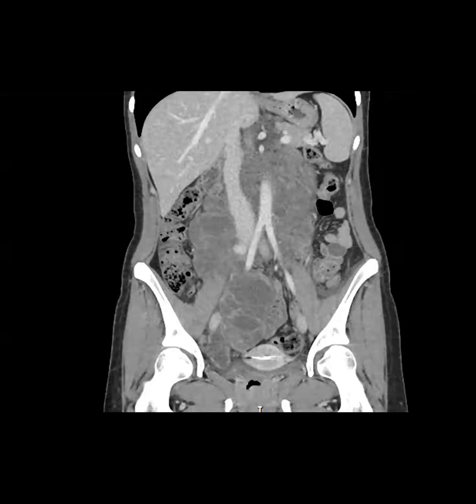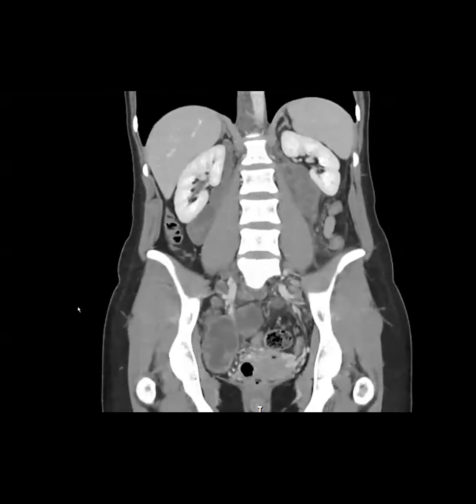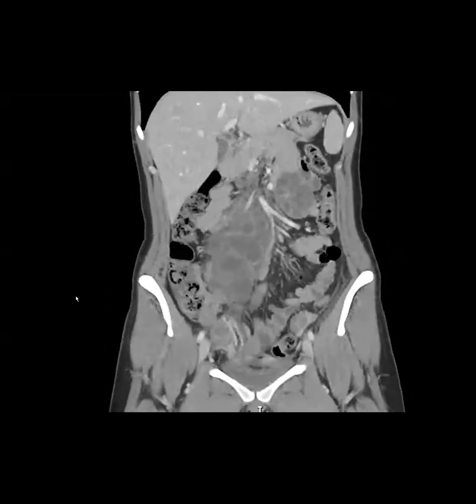So I think this must be engorged lymphatics that are obstructed due to the LAM. So it's super, super cool. And then they said there's no known cure. The drug sirolimus or rapamycin is the first line treatment for patients with LAM with abnormal or rapidly declining lung function. So it's mostly pulmonary, can be associated with TSC, tuberous sclerosis complex, and then occasionally can have this lymphatic stuff, usually with just chyle, but this one looks like lymphatic engorgement. And that makes sense, the way the distribution is along the lymphatics, right? Yes. Even the paraspinal stuff is where the cisterna chyli goes up to become the thoracic duct.